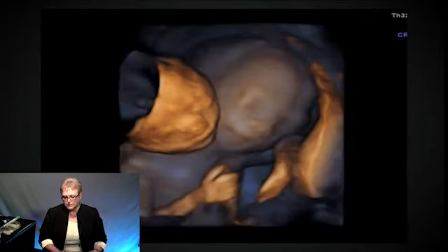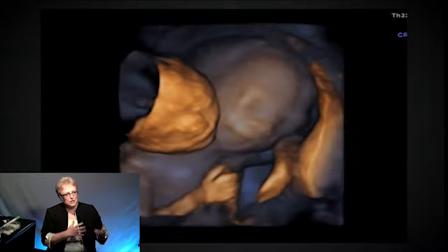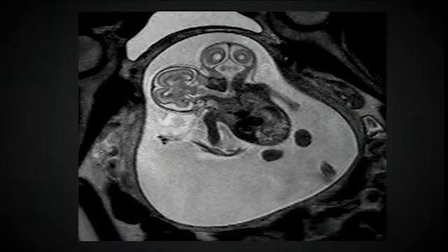And these are the babies. And it was interesting, there was more flow on the left side than on the right, so the left side of the body was a little bit larger, was measuring on target, and the right side of the body was measuring a little bit smaller. So this is just the 3D. So you can see the one spine, and you can see how it divides off on the two calvarii. And then the MRI. You can see how it splits off right here.